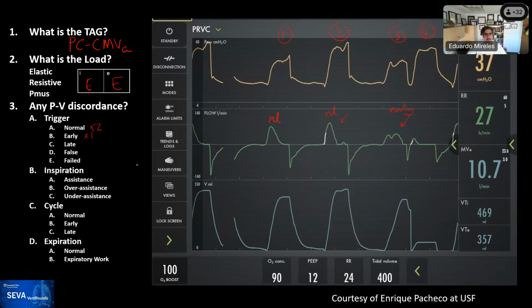And then during inspiration, on the first one, there's no activity. On the second one, there's some work shifting. And on the third one, there's more, but remember, when there's early trigger, you're always going to see some work shifting, so we don't count that one over here.